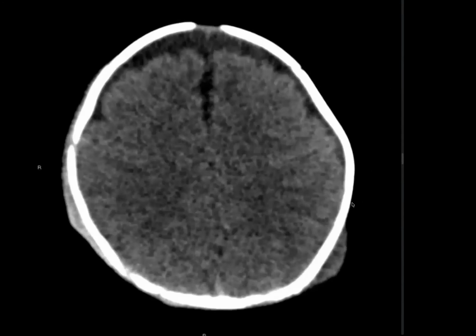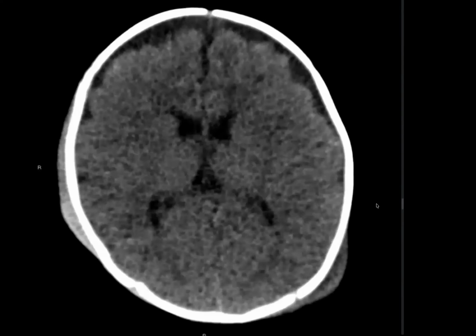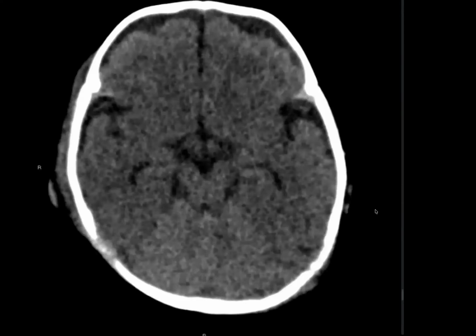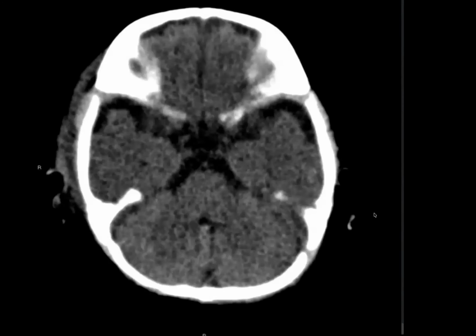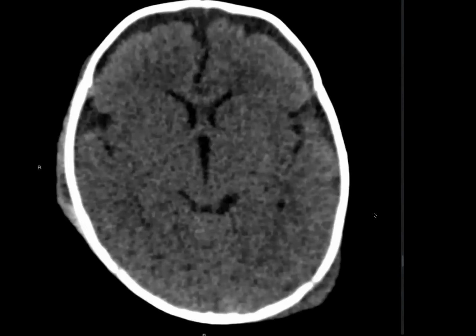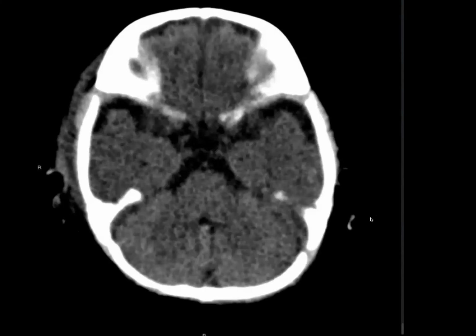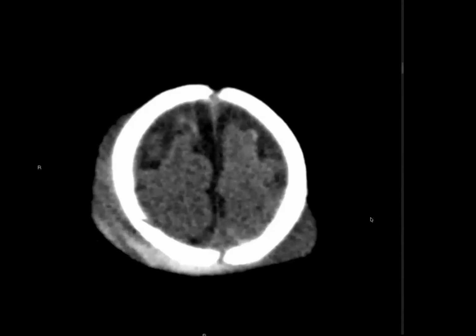So there is a soft tissue lesion in the superficial scalp area on the posterior aspect. And I can see that there is widening in the region of the left lambdoid suture, and the soft tissue is in the posterior aspect on the left side.